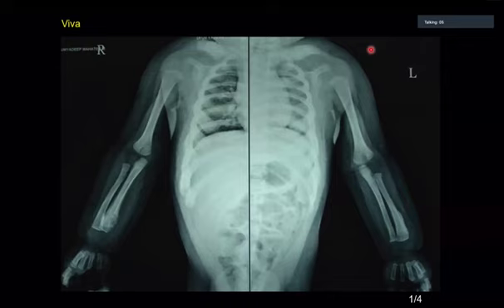The ribs also show the periostitis. So no evidence of any fracture I can see in these views. I can't appreciate the digits on these limited views, so maybe the fingers are absent.